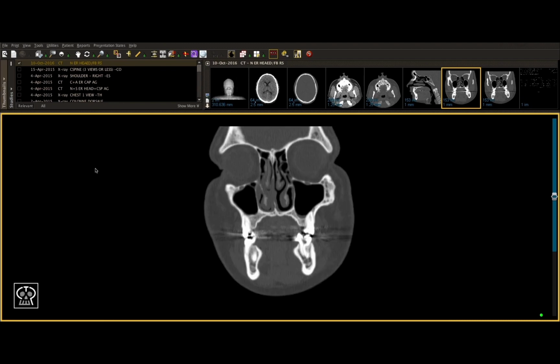The last thing I'd like to mention when it comes to orbital fractures is that you need to determine whether the orbital fracture is an isolated fracture or part of a larger pattern. For example, a ZMC fracture, an NOE fracture, or a Lefort fracture. This is something we'll go into more detail on when we review our ZMC and NOE fractures in a future module, but always remember to look at these other structures and determine if there is a common fracture pattern that you are seeing rather than an isolated fracture.